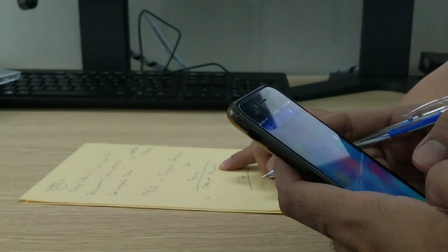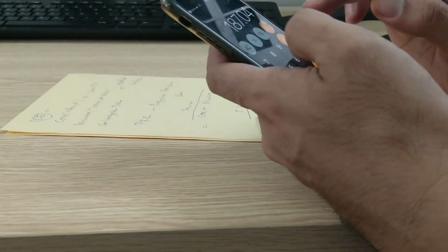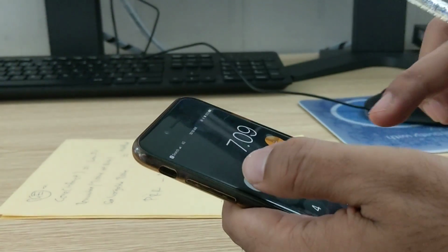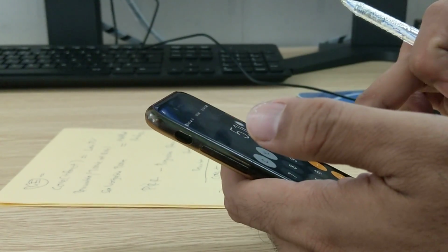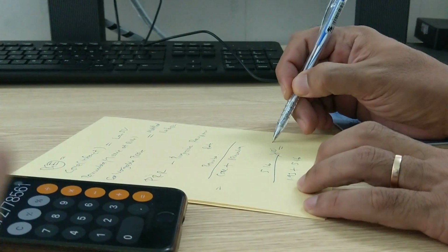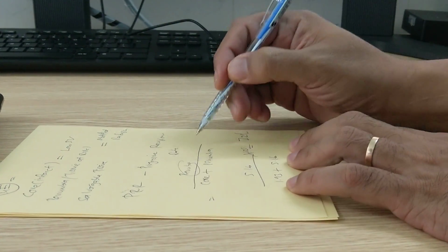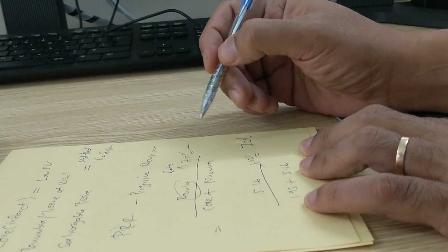Penumbra, 5.16, this 5.16 is penumbra. Add together, so you will get 1.93 plus 5.16, 7.09. 5.16 divided by 7.09, so you get 72%. Okay, the cut-off point is if the penumbra is more than 70%, you can go cathlab.